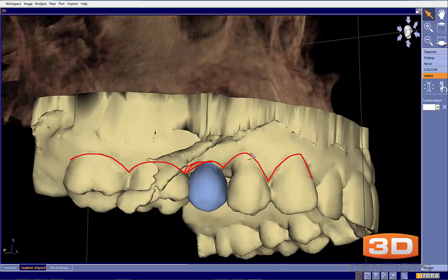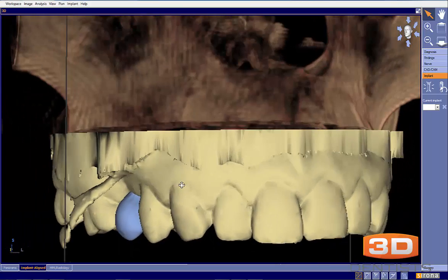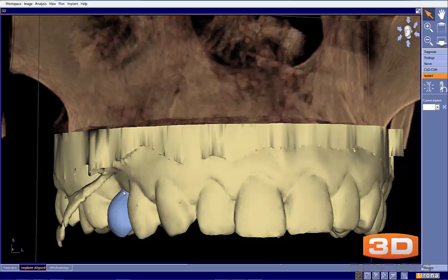So, my initial thought is more than likely that's actually designed pretty well. I mean, it's close, but I would have designed this just a hair higher. Okay, and the reason is just, again, it helps determine exactly where you want to put the implant vertically. And if we take a look at this, you can also see that virtual margin line, the way it's drawn now, gives us a little bit of a food trap area there.